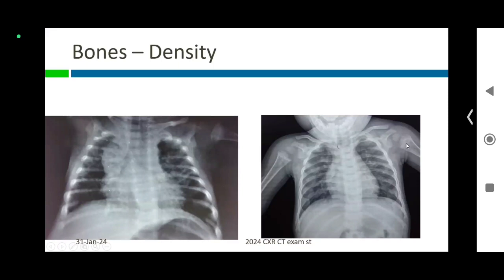Cupping. Anterior end of the ribs are very dilated. Good, Dr. Gomati. Yes, definitely. There is cupping, fraying, much more than cupping and fraying. What we need to look at is the growth plate. The distance between the epiphysis and the diaphysis, the growth plate is widened. Not only that, take a closer look at the anterior end of the ribs. It is bulbous. It is equivalent to your rachitic rosary. So it is nothing but your rickets. So don't miss out rickets in a child's X-ray.